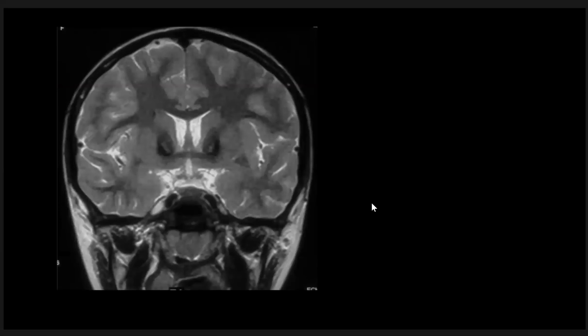And we have this patient with pantothenate kinase-associated neurodegeneration, and we see the eye of the tiger sign on the T2 coronal images.